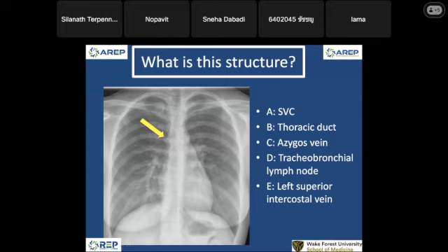We always have a problem when we put the peripherally inserted central venous catheter, or here we call it PICC, P-I-C-C, in the patient. Sometimes the tip of the PICC is going toward, not going toward, to sit in that structure. I think it's the tracheobronchial lymph node. Okay, good thought. What else can it be?